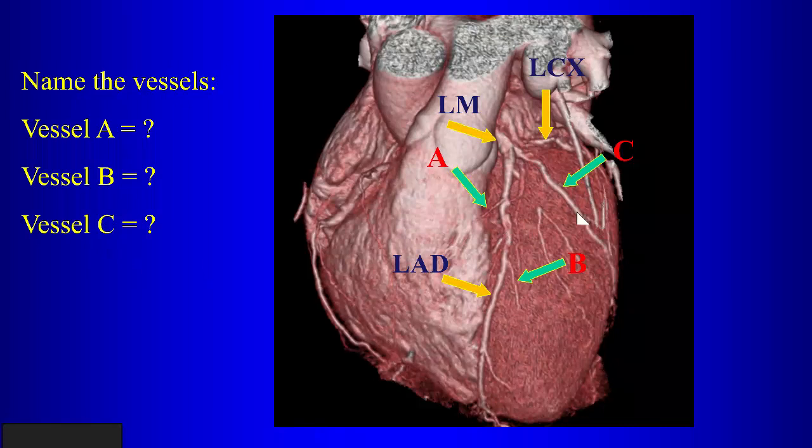So why do we call that the ramus intermedius? How did you know to call that the ramus intermedius? Not everybody has a ramus intermedius, right? So the left coronary artery branches into LAD, left circumflex, and... Yeah, so the left main Ramus.